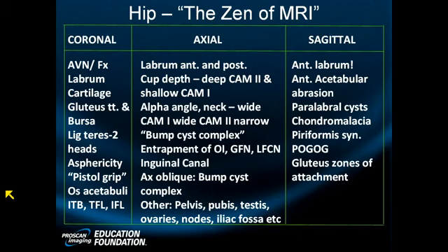An injury to the medullary bone in a runner. The typical location where you get this injury. And they're usually women, and this is a woman. Right there. Right at the insertion of the iliopsoas or right above it. Will you see a little stress fracture or stress injury? There's a little fracture right there. Let's blow it up. That's a problem.